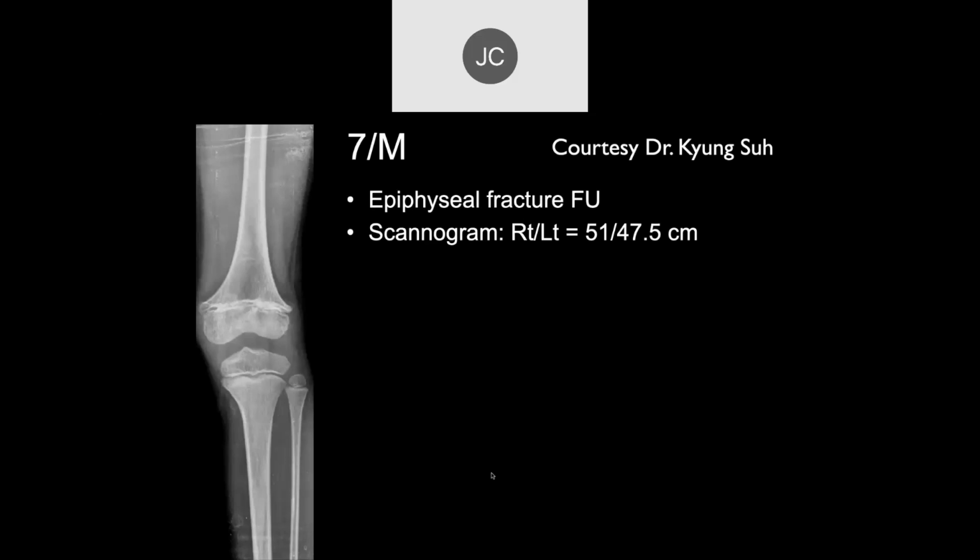All right. We have a 7-year-old with epiphyseal fracture follow-up scanogram, right left growth or leg length discrepancy. Good. Let's see.